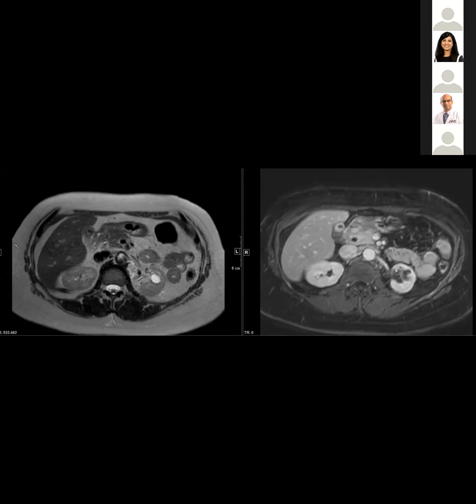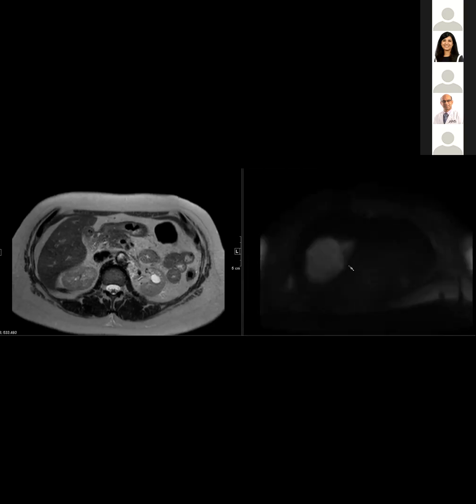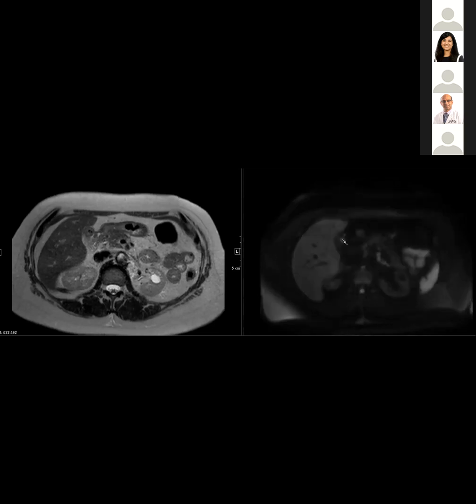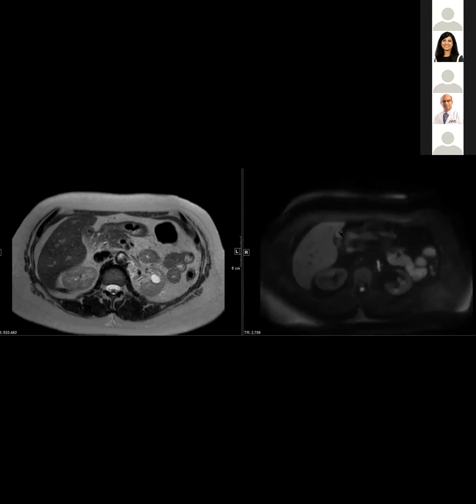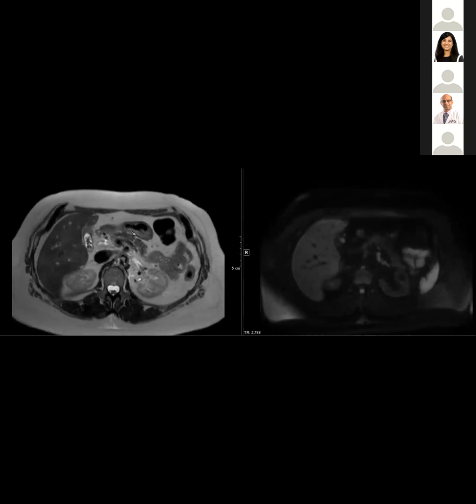I don't believe it was called anything. Then that's a miss. Then that's a miss. Let's see. No, it just said contracted gallbladder with multiple gallstones. Yeah, and then diffusion wasn't very helpful. This is one of our oldest scanners. It's questionable if this truly is restricted diffusion. Anyway, so you guys are kind of getting where it's going.